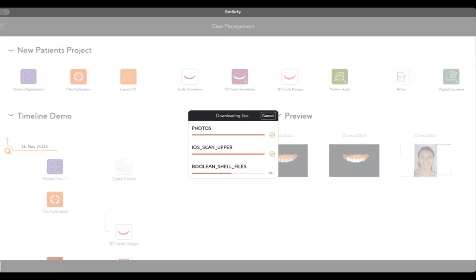But it's easy to distort the tooth with mesh editor. You distort the tooth and you can break a lot of stuff. SmileFy is safer, because if you select, for example, I open the case now, a point in the middle of the buccal surface and drag it out, you can create a more round buccal surface, very, very easy, preserving the secondary anatomy of the tooth. Gingival margins are very, very easy to adjust.